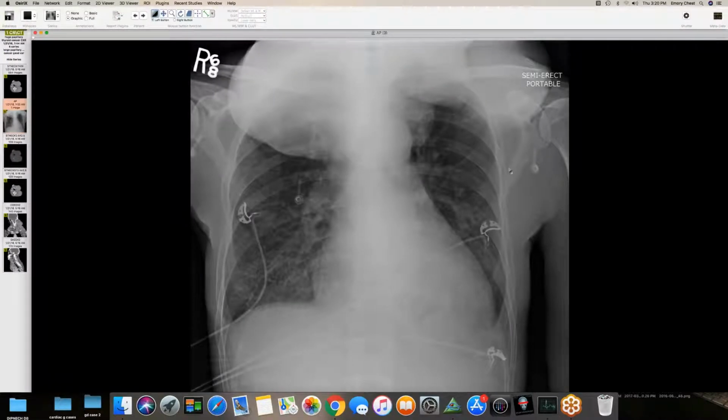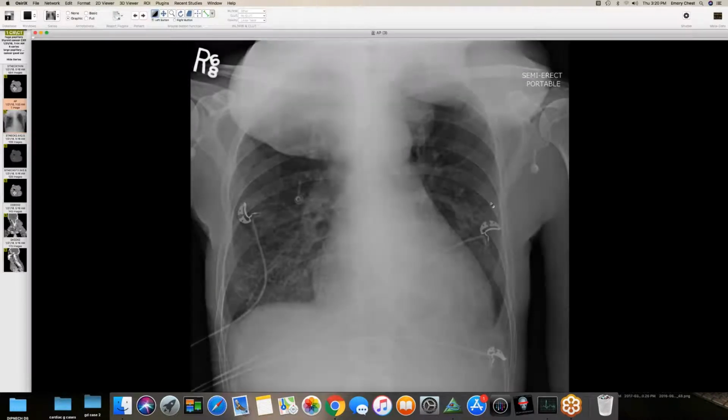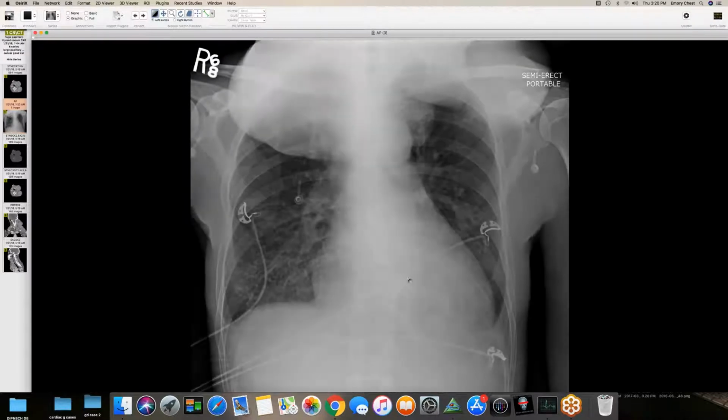Good. Okay. So this is a Grady patient in the 40s, I believe, who came in with this radiograph. Just looking at it quickly, the first thing that went through my mind for a split second is, is the patient's head in the way?